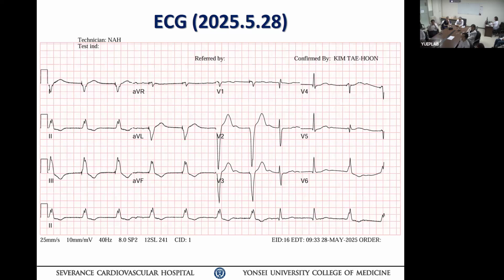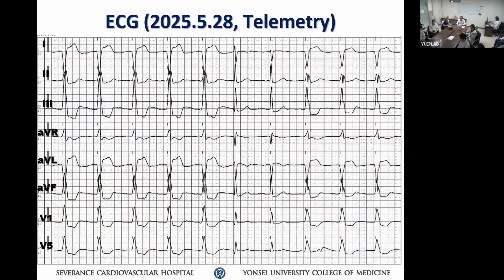Anything else? Because the time is a little short today, we're going to move ahead. Next, let's show the next trace. Okay?